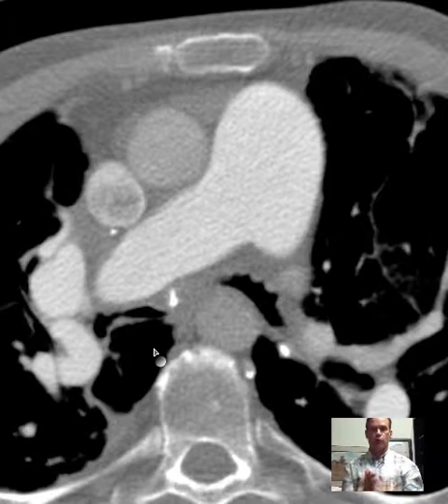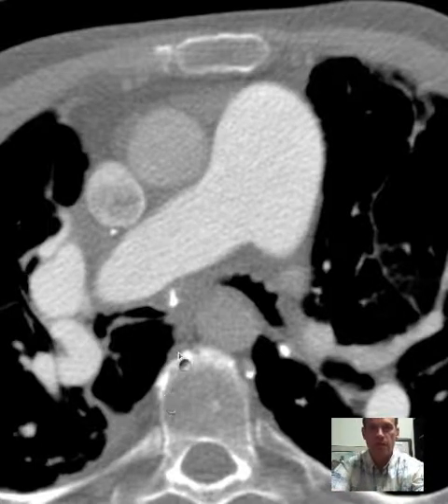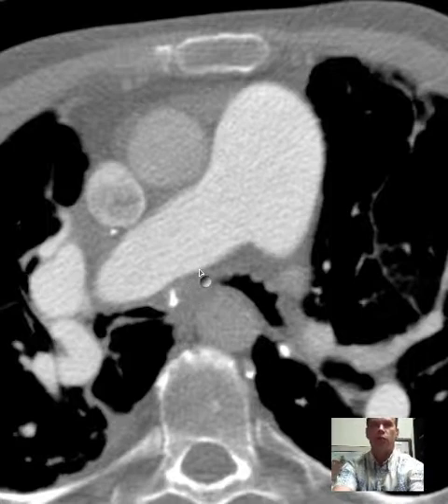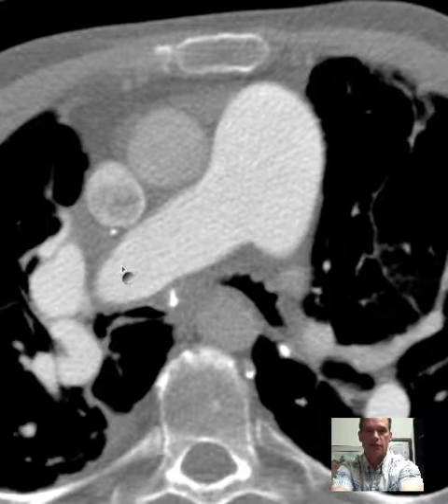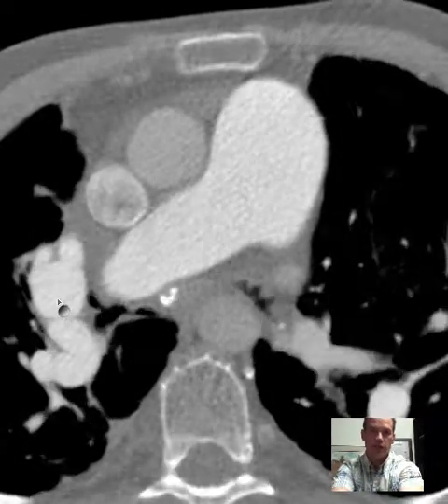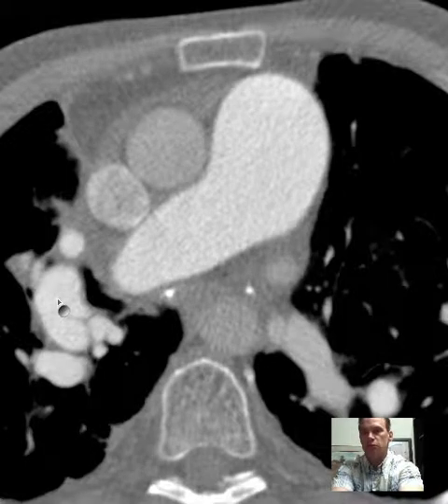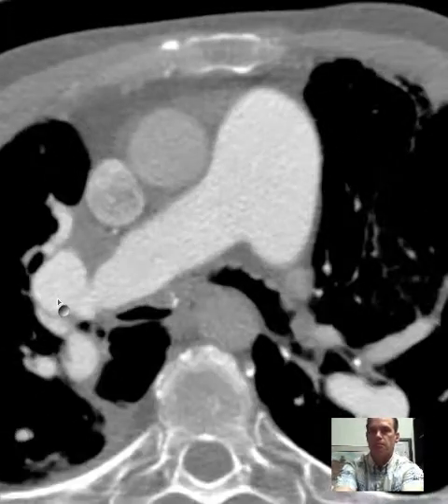So if someone has a long history of hypertension, you look at the carotid arteries, for example, they'll be curly, and sometimes the vertebral arteries will be too, and they can look even loopy sometimes if there's a long history of that. But it's very uncommon to see this severity of pulmonary arterial hypertension to the extent that you actually are getting tortuosity, curliness, if you will, of the proximal pulmonary arterial branches.